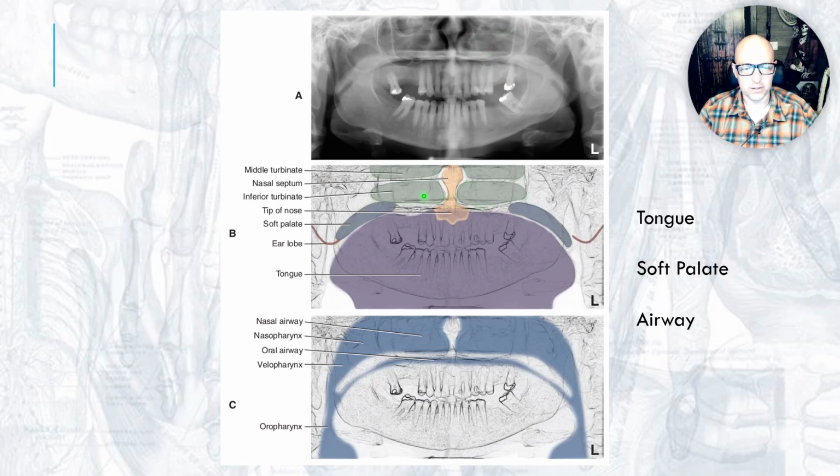This also points out some things in the nasal cavity. The turbinates, which again, like the tongue, are really stretched out and they do go really far back. If you've ever seen someone do a nasal surgery and the surgeon takes out those splints, it's like 5 inches back into their skull. And so they are large structures. It goes a ways back here. It overlaps beyond the maxillary sinus. That's how you know it's not something that's contained to the sinus.